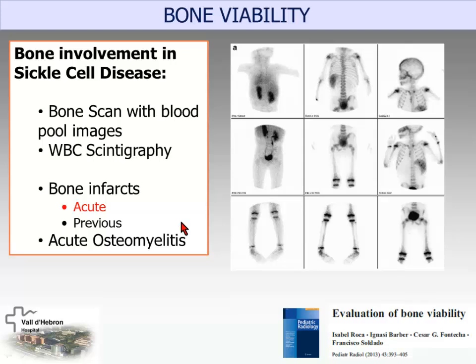Okay, a volunteer. What can we see on the blood pool image? Is it normal? No? What about the pelvis? Are these pelvis iliac bones symmetrical? No. We cannot see the left, no? And here on the feet, there is an increased uptake in the blood pool.